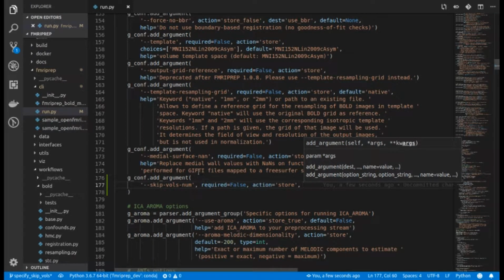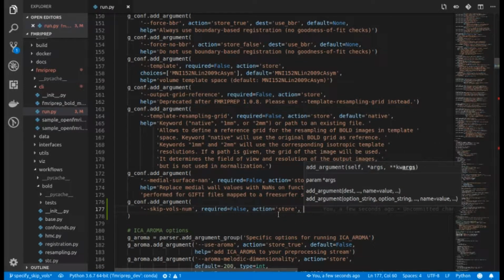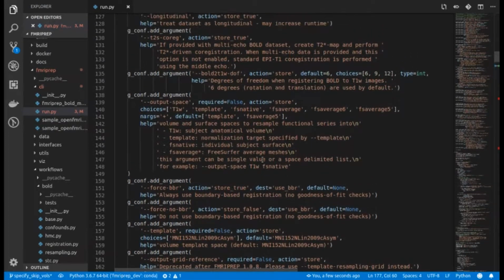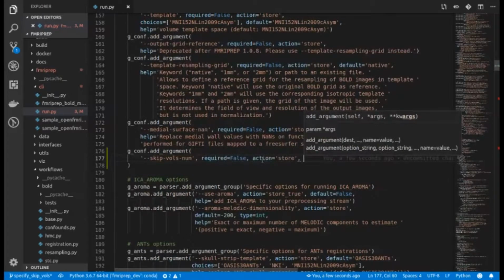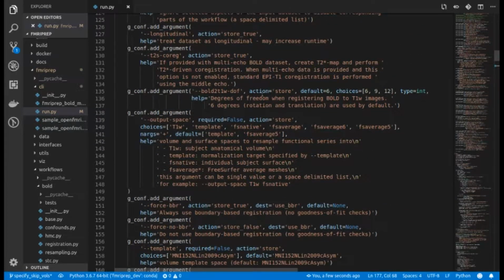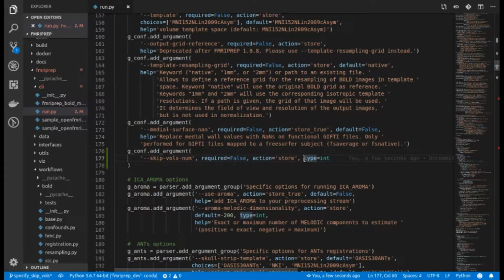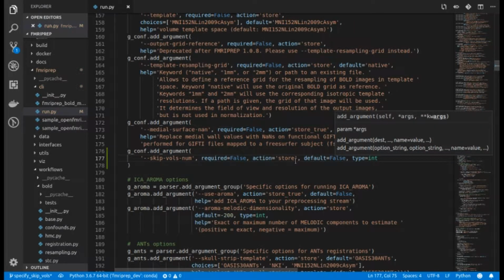Okay. Then, or it's just a boolean. Or no, it's a number. Well, either, let's see. Either it's going to be an integer or it's going to be false. Close it. And I will use maybe, okay, 5 to 6. Yes, I'll say, can I have the default be false? Type is an int. Guess we'll see what problems that causes.